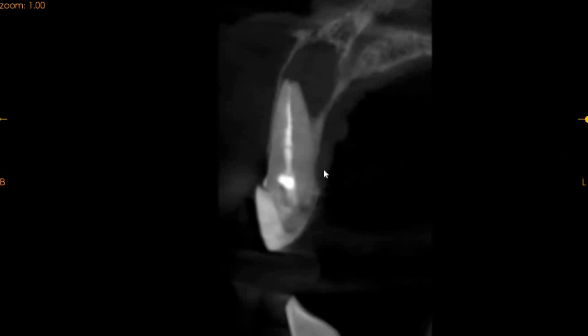Moving to the central incisor, on the central incisor we can again see that the root canal does contain voids and there is a significant radiolucency, and this time this radiolucency is approximately 7 millimeters by 7 millimeters. Now this is again a very considerably huge radiolucency, which is also compromising the alveolar bone underneath the tooth.